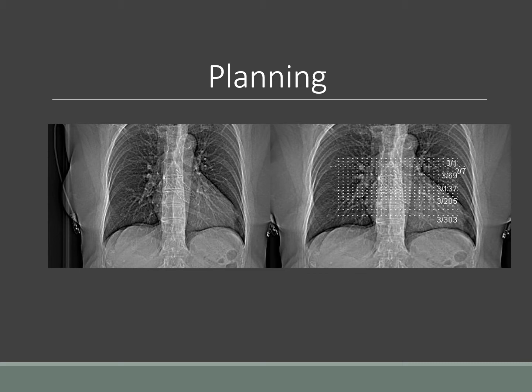The first point includes the planning of the CT itself. As you may see, on the left side is the scout of the chest. On the right side is the scout of the chest, including the lines focusing only on the area of the aortic valve, focusing only on the area of the TAVI stent. Most of those patients have been exposed to radiation during the coronary catheter and during the CT preparation before the TAVI. Our role as radiologists is to decrease the doses for those patients as much as possible. Therefore, focusing only on the aortic valve area or on the stent would help, of course, to reduce the doses as much as possible.